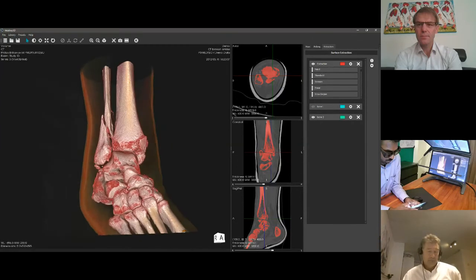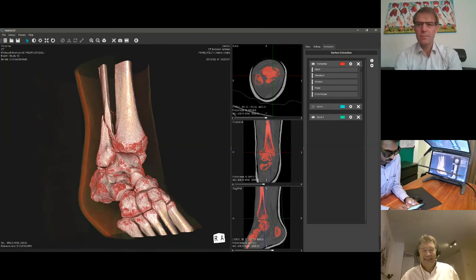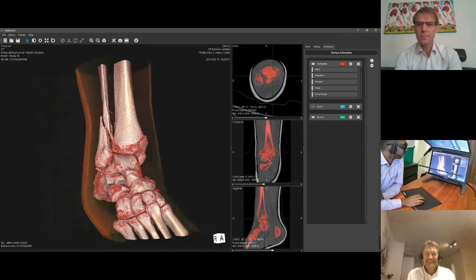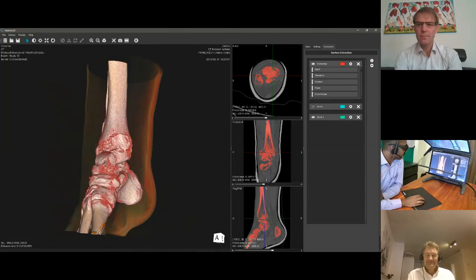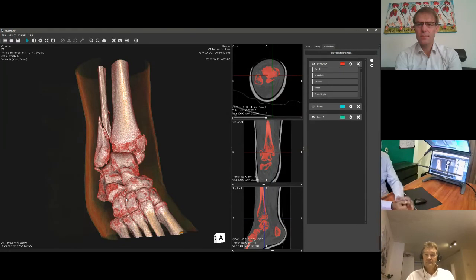Great. Mark? Yes. Well, in the meantime, I was just showing you something else on screen. I was still sharing it. We have been looking at some data from the thorax area, some vascular information, and some stents in this session.